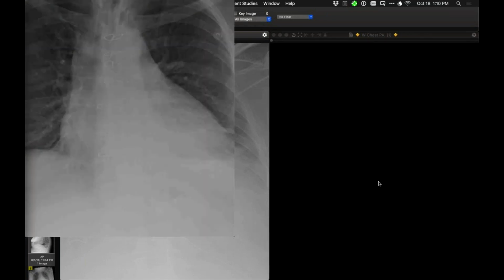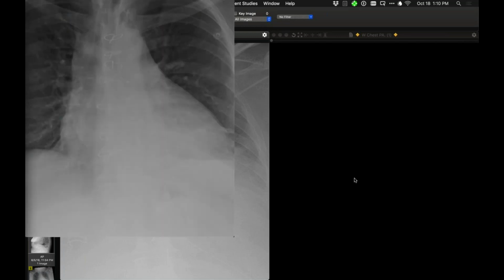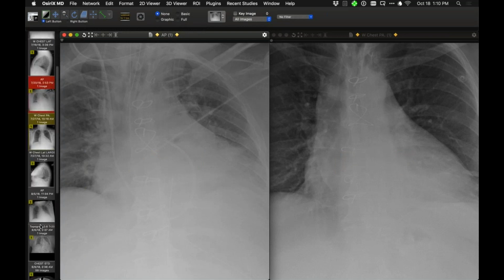So at this time, if we look at the sternal wires, the top three, first of all, they're all actually intact. The top three are straight, but these three have moved a little bit rightward. So intact, but the alignment of them has changed. And this is soon after surgery, just about 7 days. And you'll see what happens next.